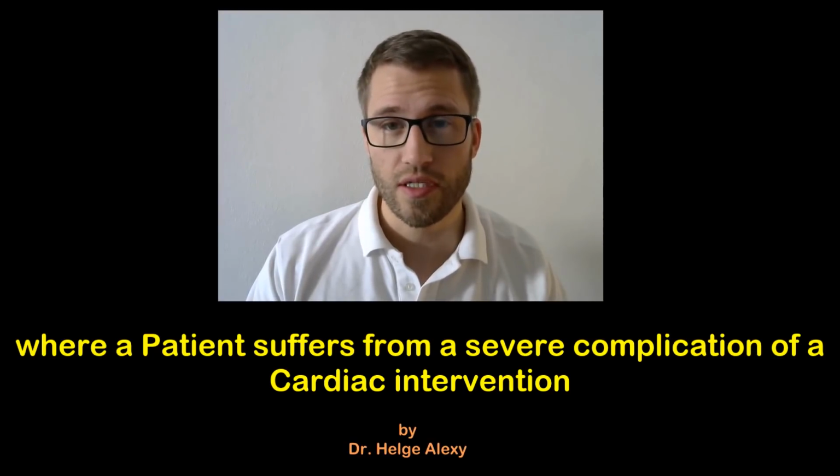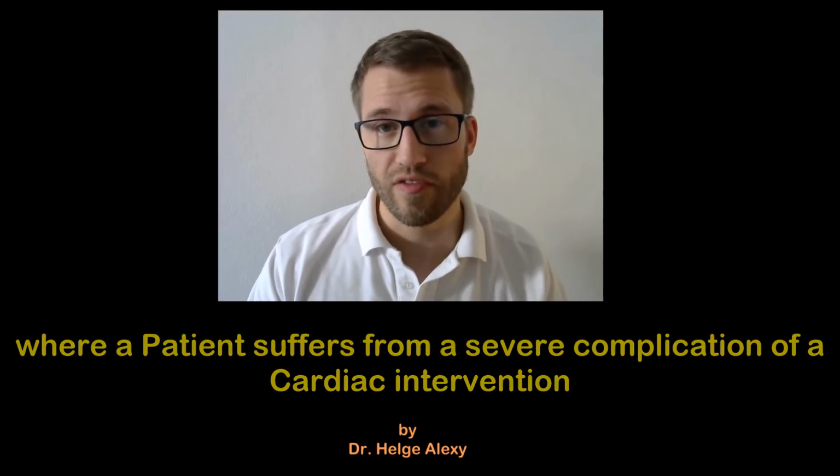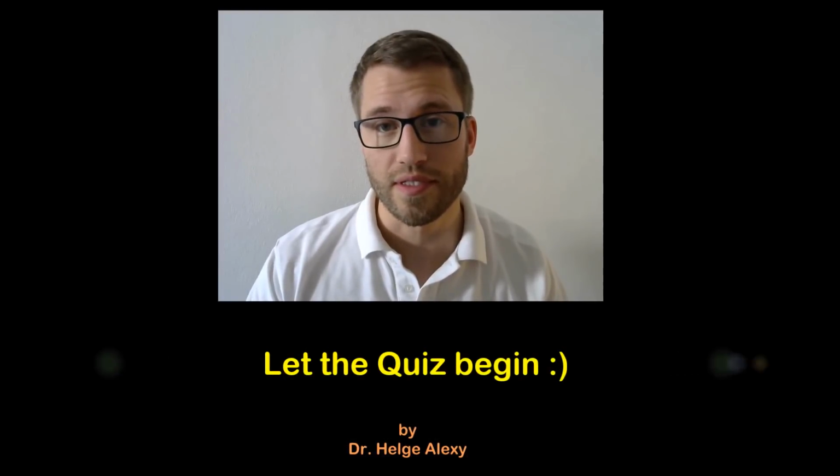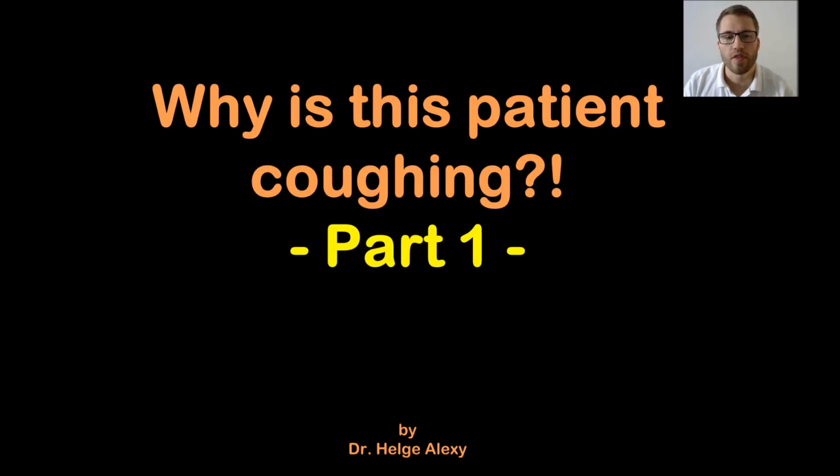Today I want to show you a clinical case about a patient who suffers from a complication of a procedure he got some time ago. Well, let's get right to it. I called this clinical case "Why is this patient coughing?" and this is part 1. Part 2 will come in a couple of weeks.